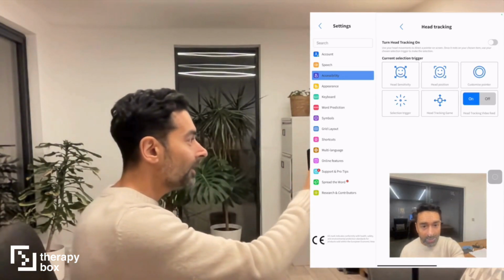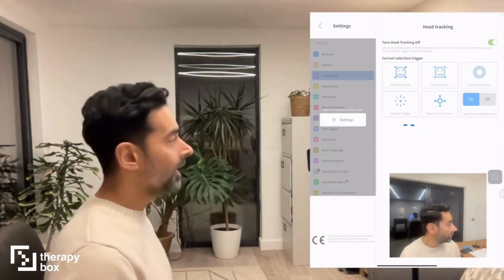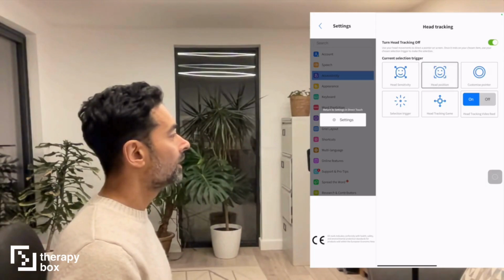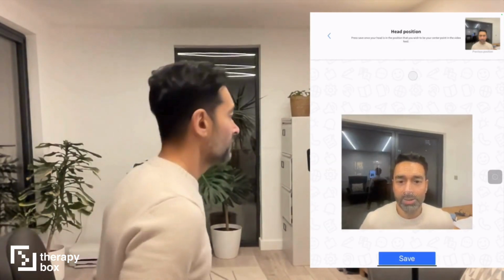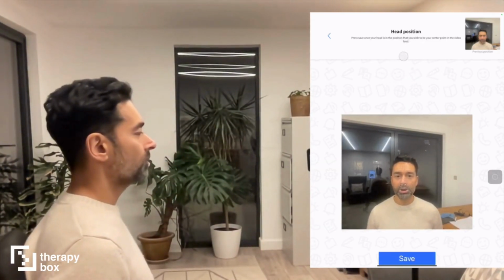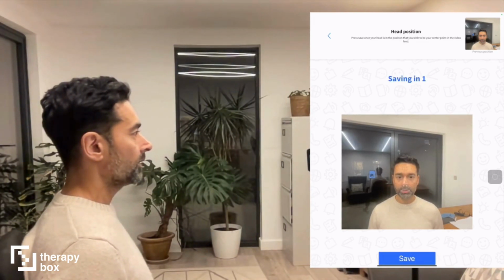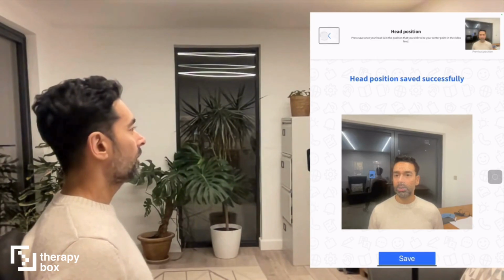So let me get started by turning head tracking on. There you go, I've turned it on. I'm going to go into position, so I'm going to set myself up nicely. I'm going to get in the position I want, and then I'm going to say save. It gives me 3 seconds to get myself ready. Okay, I've got myself a good position.